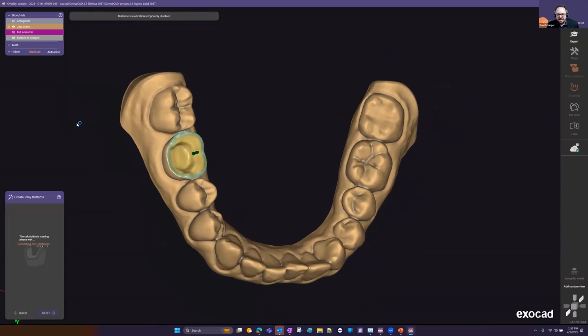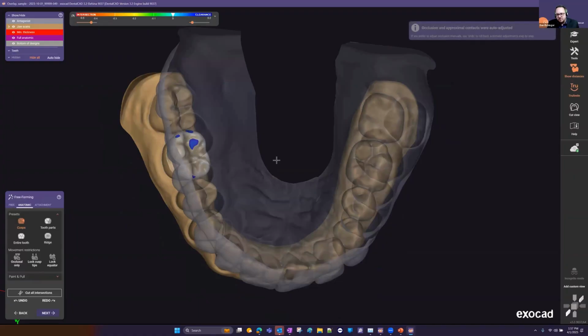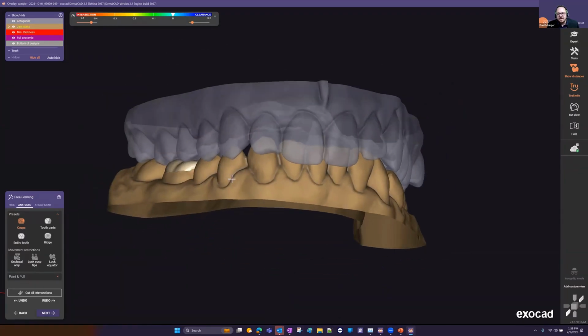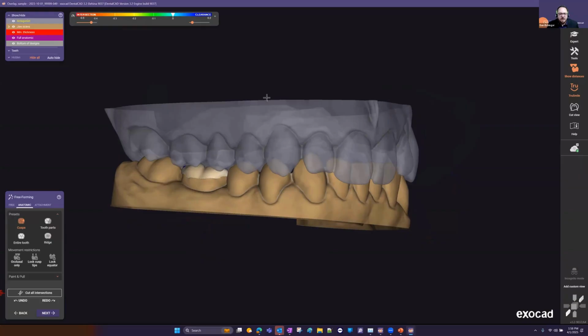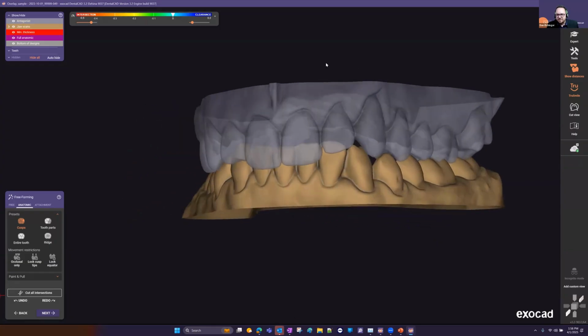And with basic crown design, with our software, there's tools that as you're positioning your tooth library, you're rotating, you're scaling, the software's automatically adapting to the occlusal surface. There's so many features built in that make designing so simple compared to what it's been in the past. And I think there's a misconception with Exocad. I've heard people say it's so difficult or complex. If you're in the wizard mode, it's beyond simple. And to add on the complexity of our software, we do have expert mode.